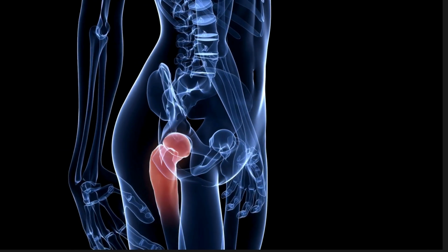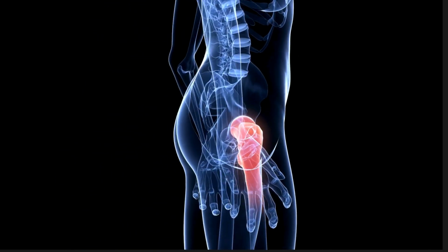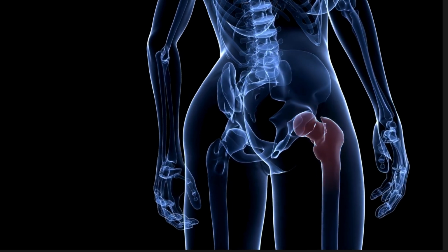Today we will be taking an in-depth look into hip fractures. We will dissect the different types of hip fractures such as intracapsular and extracapsular whilst explaining how these may affect patient prognosis and treatment. Let's dive in.